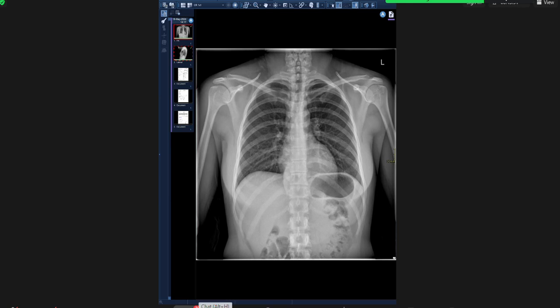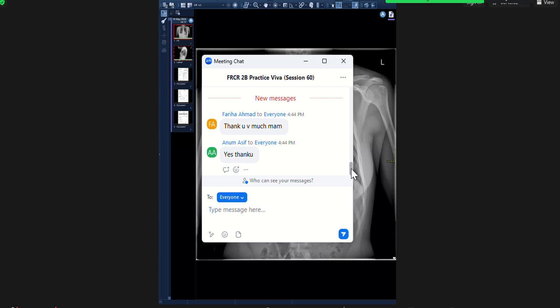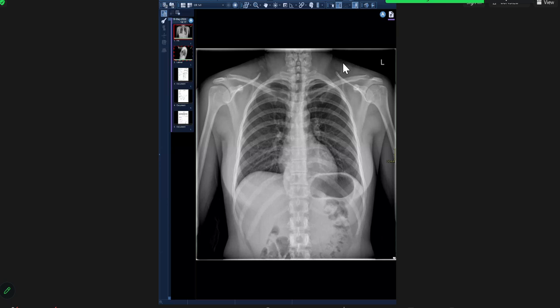After we finish this case, I'll go back to the sickle cell case. I don't really think the liver was inferiorly displaced or something like that, which would indicate something. The spleen was atrophic in that patient. However, it was not well seen even on ultrasound, not an X-ray.